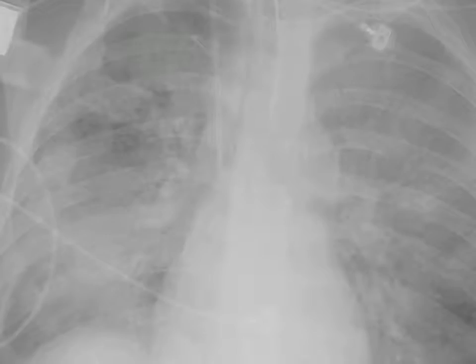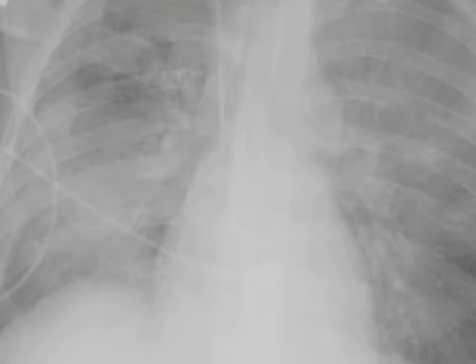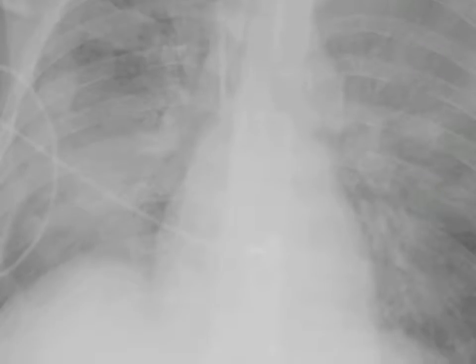In the supine patient, the fluid accumulates posterior to the lung. This gives the lung a uniformly veiled appearance. Occasionally, fluid can be seen beside the lung in a similar fashion to the meniscus sign on the erect film.